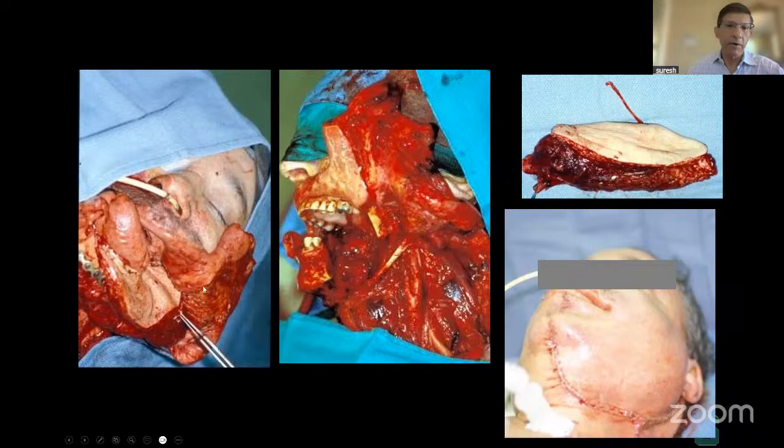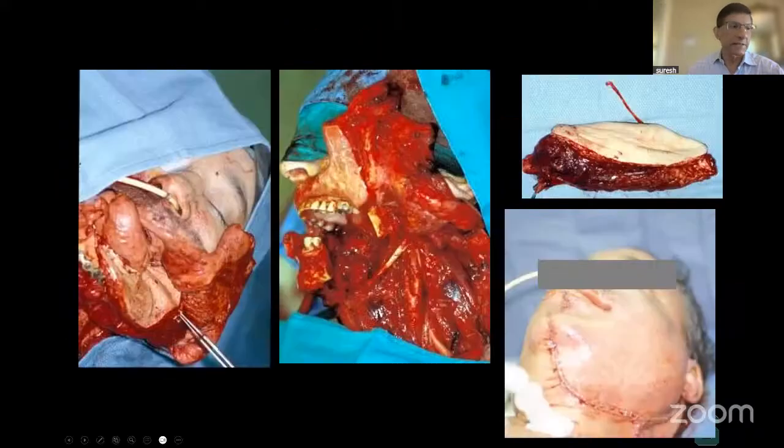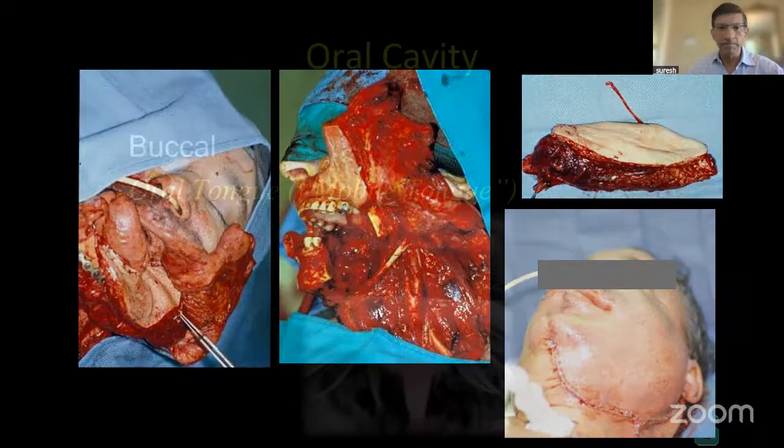But from our standpoint, anytime that patients have this type of erosion right here, this bone erosion, then this usually necessitates some type of free tissue transfer and some type of free flap. And it was mentioned earlier, these are much more extensive procedures that require substantial surgical planning. But on the other hand, this is where we've really made a difference in head and neck imaging, because we are the ones, based on our imaging, that determine whether or not these tumors can be treated with wide local excision or they have to undergo some type of composite resection.